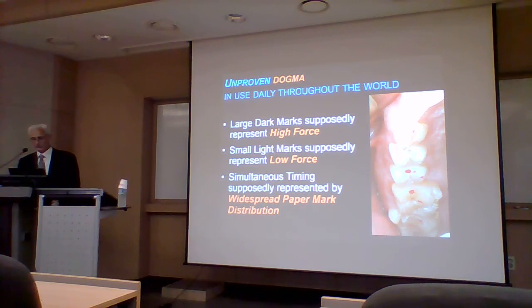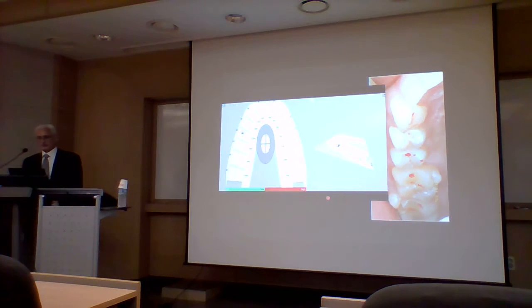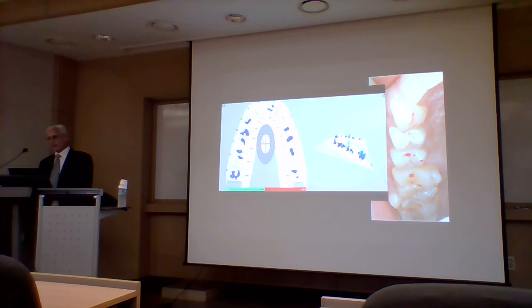So when you look at something like this same patient with the T-scan, you see that the size of a mark and the load has no relationship. So let me just play. 잘 해석을 하시면 저렇게 볼사이처럼 가운데 비지 않고 잘 찍힌 거가 실제로 이제 갭이 있는 컨택인데 그걸 갖다 그렇게 해석을 못하는 거죠. So you can see that things don't happen at the same time, even though the marks say they do at the same time.